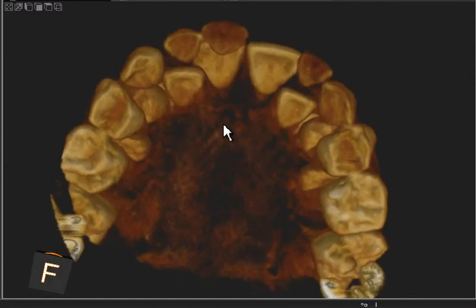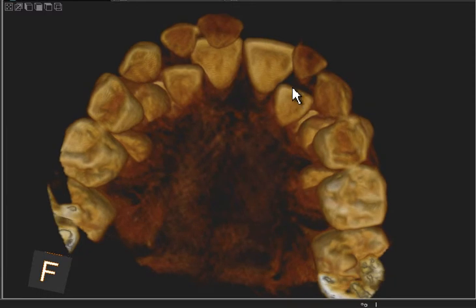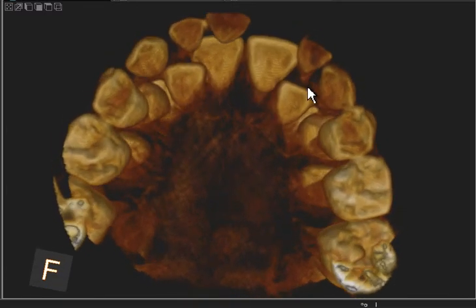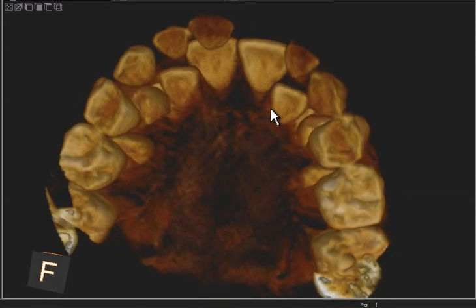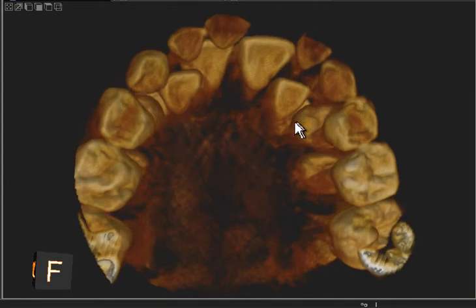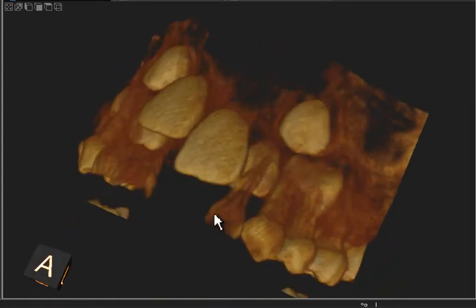You can see the same thing happening on this side. There's your central. There doesn't seem to be any damage to the teeth, but at the same time, it's not moving in a position where it would erupt favorably into the mouth. You can see all this crowding across here. Quite a dramatic, different view than we get from a panoramic x-ray in silhouette.